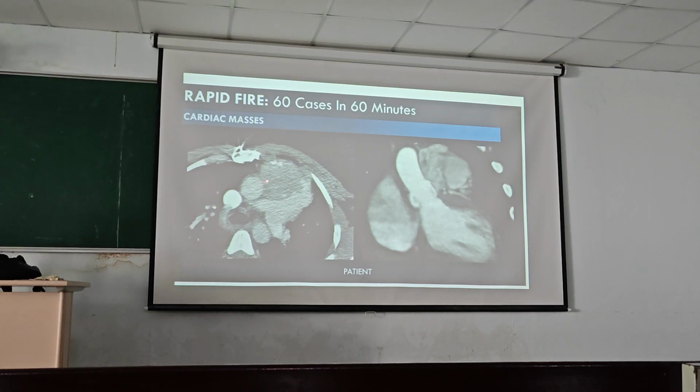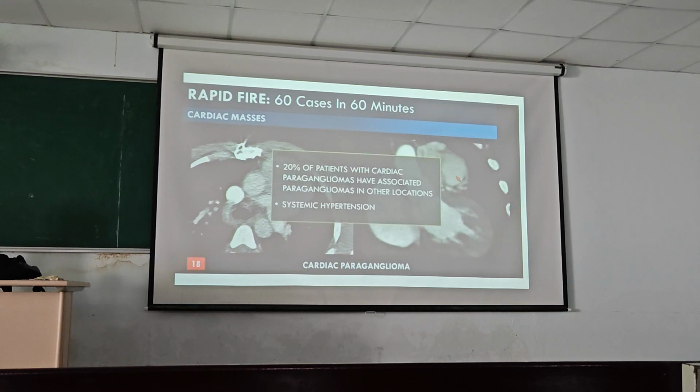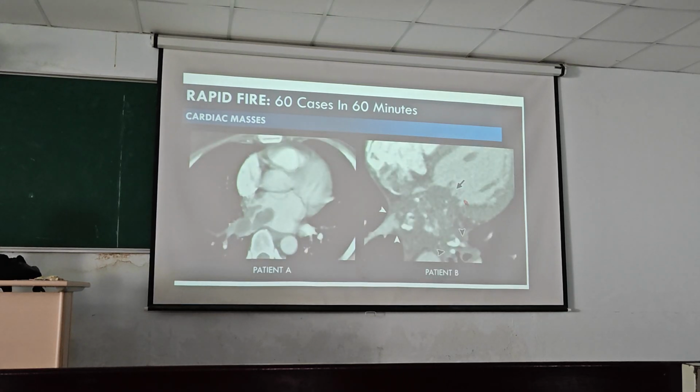So there's a mass here and there. So this is a paraganglioma. It's one of the rare ones. I'm going to skip that.